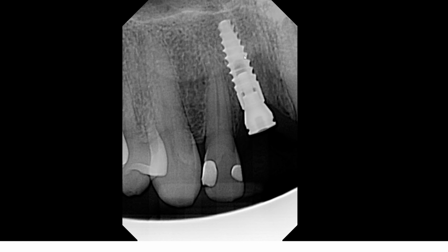For those cases you then need to retake the radiograph. So I wanted to briefly mention that. If you want to get rid of this cone cut image, or fix this area, what you'd have to do is bring a round collimator more toward this portion of the sensor so that you are giving radiation dose to this area.